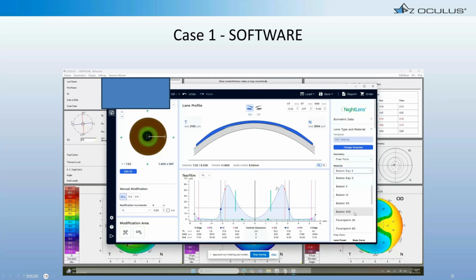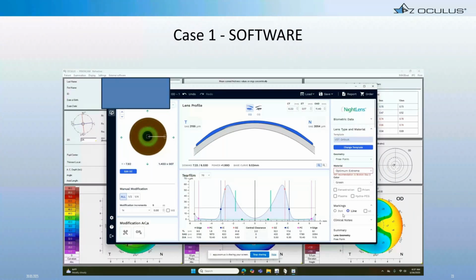And we've chosen, it's given us optic zone. We've chosen a 5.5 optic zone with a 6.3 intermediate curve width. So we've got a reverse curve of about 0.8 of a millimeter, which is ideal. And then really just a nice looking lens fit all around at this stage. You're going to choose your lens color, whether you want it plasma treated, fenestrated, hydropegged markings, etc. All this is good to go. We're going to hit order and our lens is going to ship.